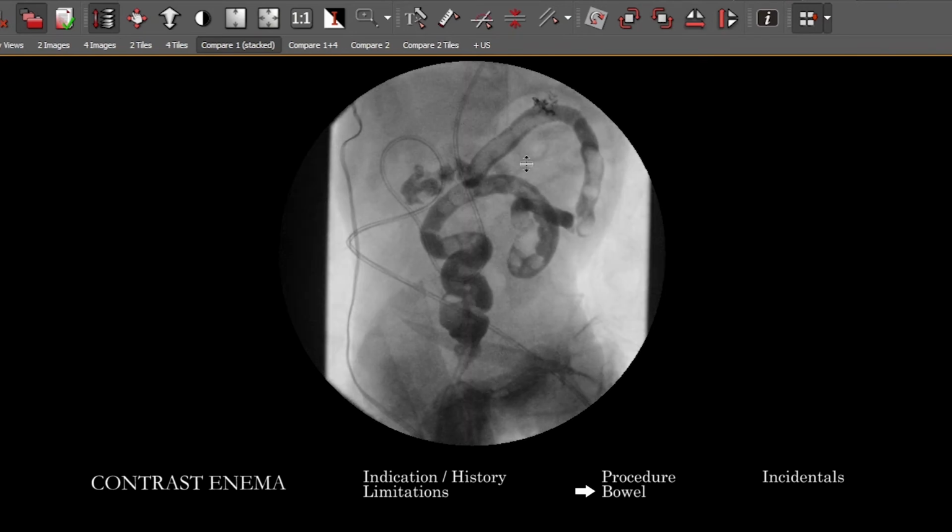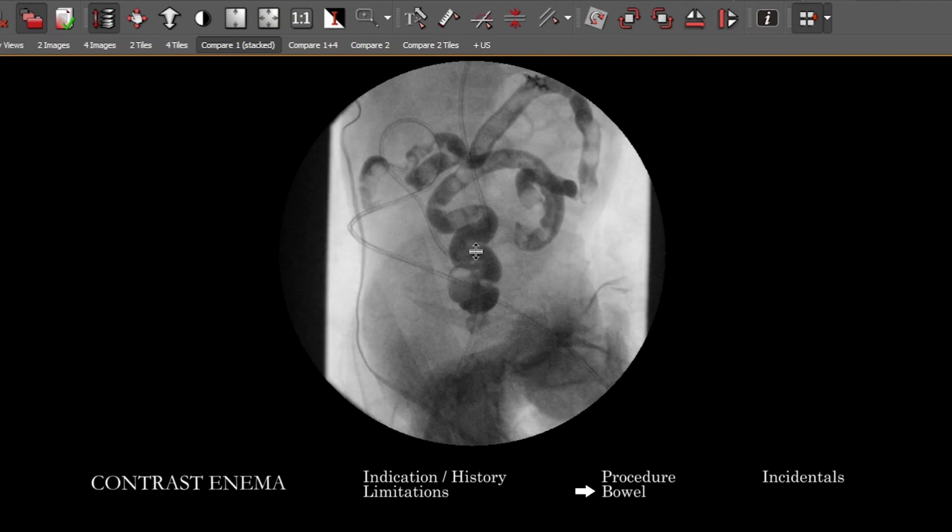Are there other areas of change in caliber? If you take a look at the overall morphology of the bowel, does it seem like the entire colon is small? So not just changes in caliber focally, but diffusely. The classic differential in that case is going to be ileal atresia or meconium ileus, rare total colonic Hirschsprung's, or again, all very rare, megacystis microcolon intestinal hypoperistalsis syndrome.